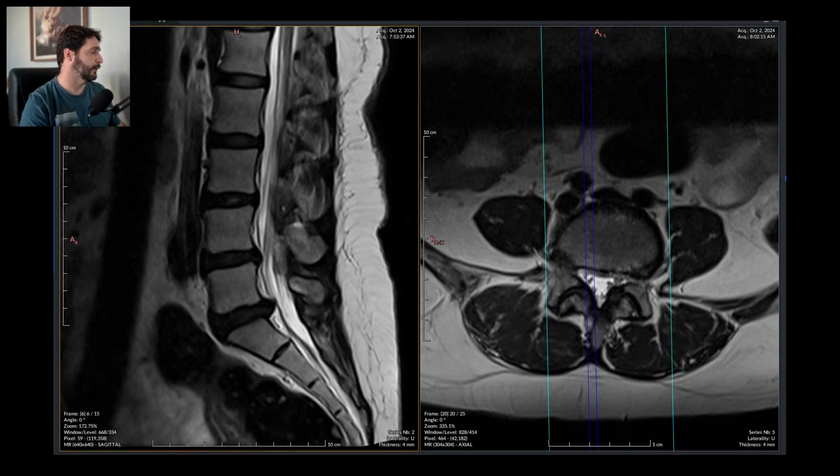So I'm just going to grab my template. I have a template that is quite like this case, so my life is much easier. Just going to fill up some gaps so we can move on to the next case and report yet another exam this afternoon.